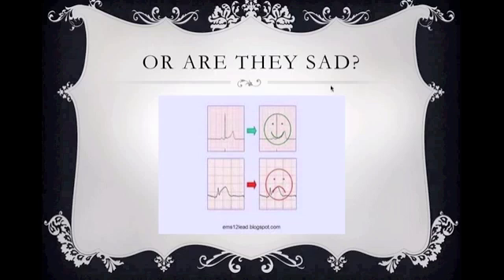Oh, now here's a comparison. Happy face, frown face. This ST segment is happy. This one is bad. This one is sad. All right. Happy, sad. Again, thank you, EMS 12 lead.